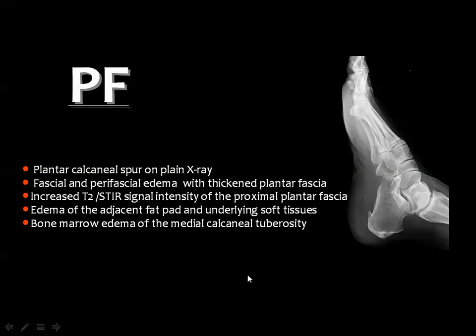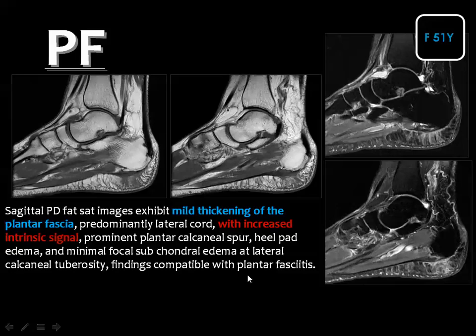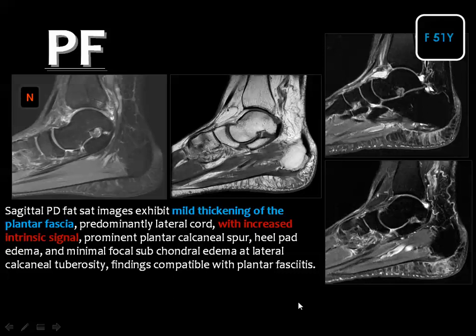But in order to diagnose plantar fasciitis, you should have an MRI looking at the plantar fascia, which in those patients will be thickened and will show abnormal signal. It may be ruptured and also may show soft tissue edema in the heel bed of fat in the form of low signal in the T1 and high signal in the T2 and the STIR images.